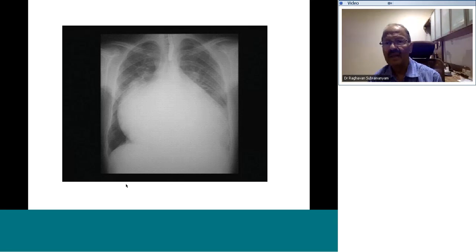So this is also a massive cardiomegaly like the last one. Right ventricle is enlarged, RA is enlarged. Sakshi says, right. Somebody said some bag appearance. Massive cardiomegaly and pericardial effusion. Another answer from Akshata: massive cardiomegaly and massive right atrial enlargement. Yes, right atrial enlargement is there, massive cardiomegaly is there.